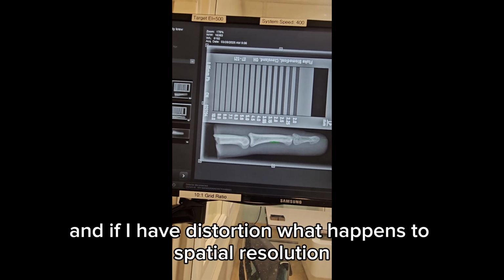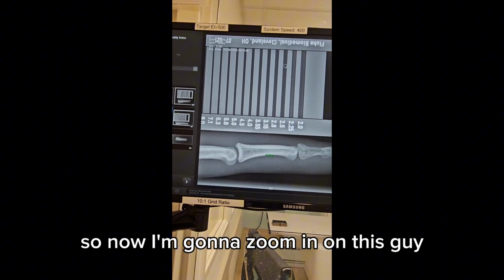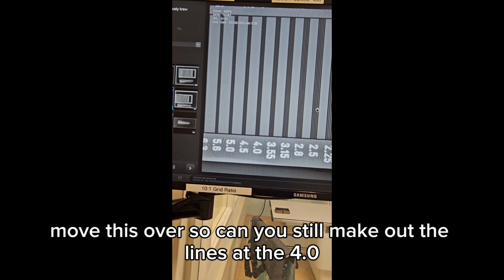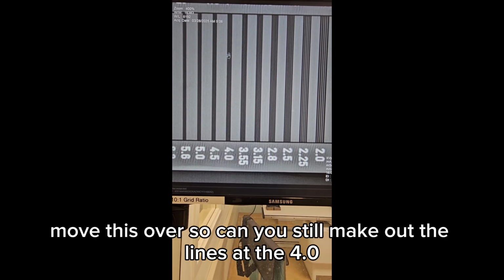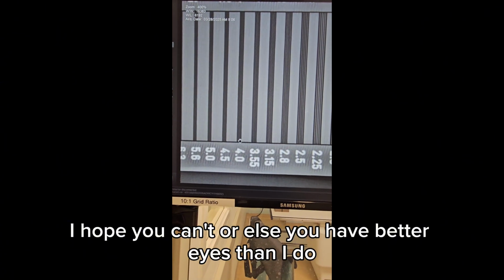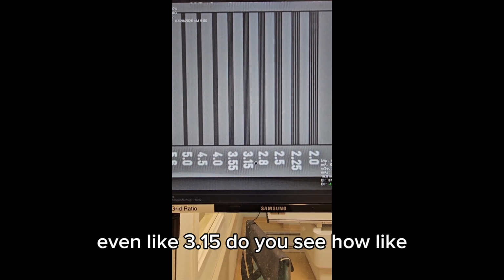And if I have distortion, what happens to spatial resolution? Remember, they're always inverse. So now I'm going to zoom in on this guy. Move this over. So can you still make out the lines at the 4.0? Right? You can't. I hope you can, or else you have better eyes than I do. But we can kind of still see 3.55, even like 3.15.